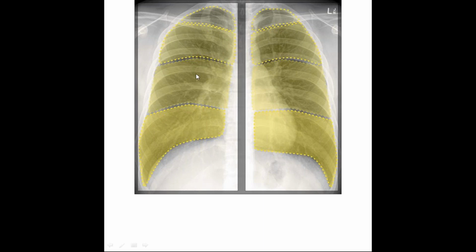After you've decided that yes, it is a decent enough full inspiratory film, you go for the breathing aspect, and you see that the lungs on the right and the left are almost equal. You compare the apex, and you compare the upper, middle, and lower zones. When we talk about X-ray, it is the zone. When you talk about the anatomy, it is a lobe. So it is upper lobe, middle lobe, and lower lobe on the right side, and upper lobe and lower lobe on the left side. That is what is taught for the anatomy.